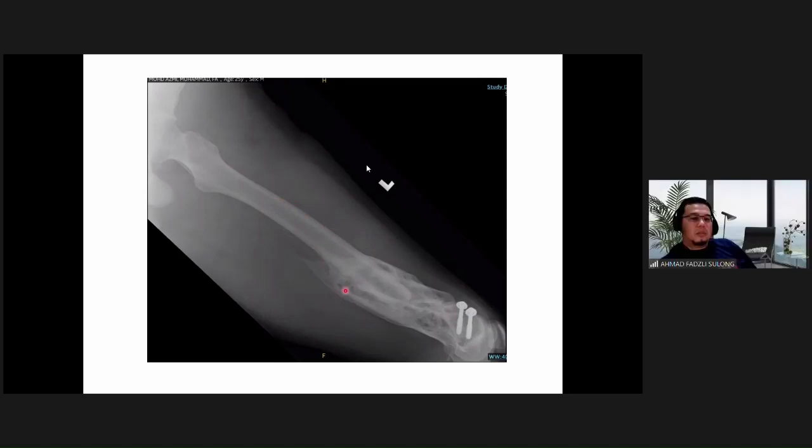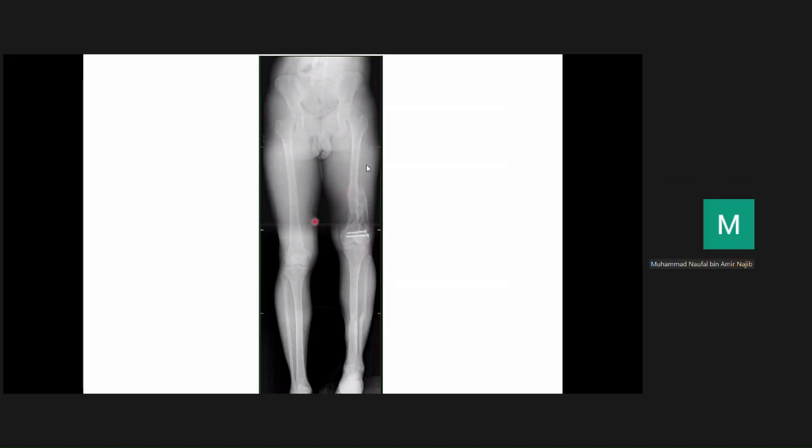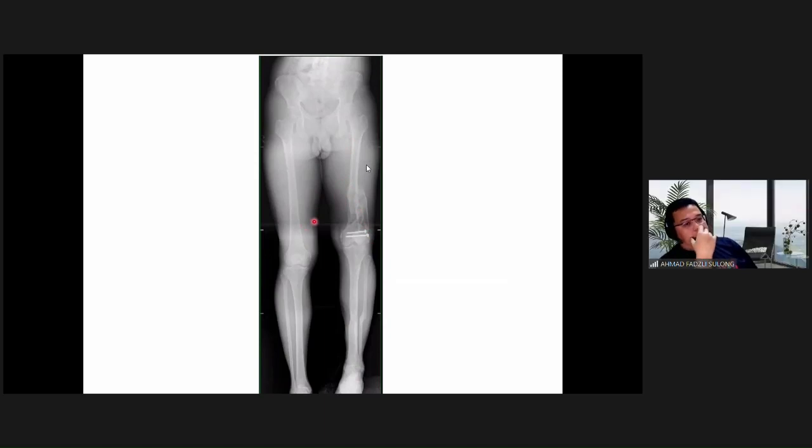Yes. So this is more posterior. So it is posterior angulation. Kalau this one, it is? Medial angulation, right? So angulation, remember that whenever you describe angulation, the reference should be the apex of the angulation. Okay? So this is the case of malunion. All right.